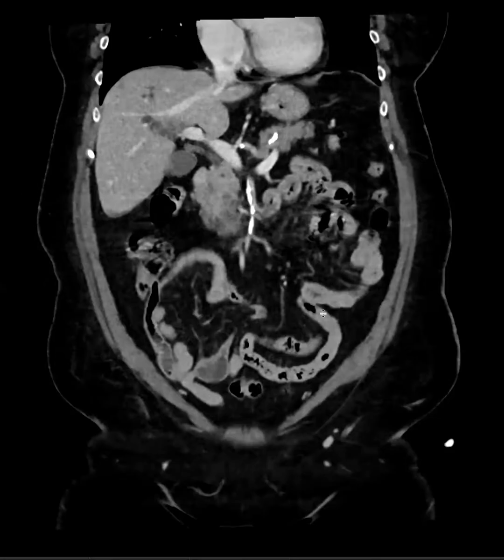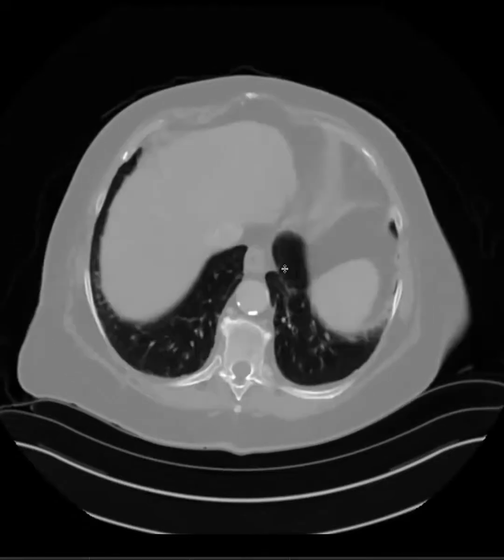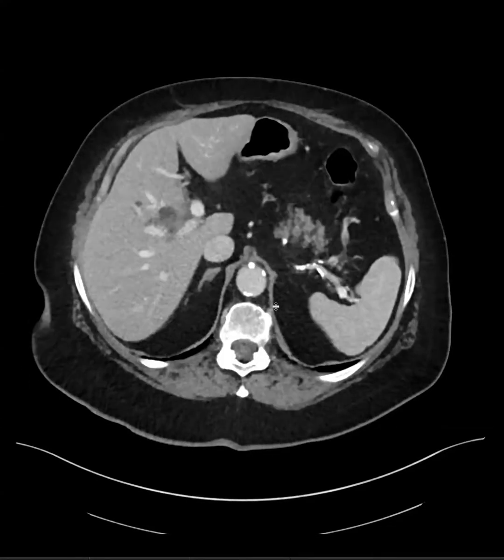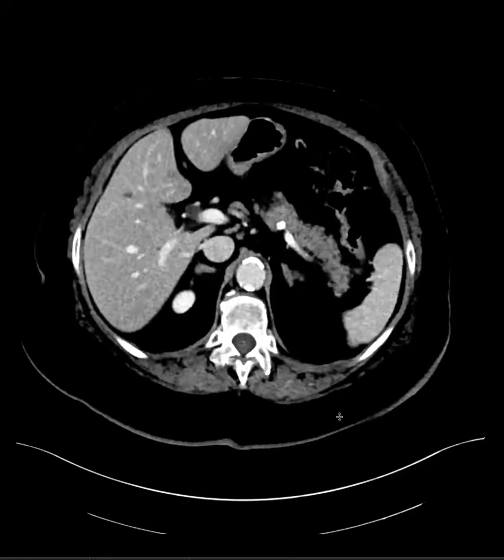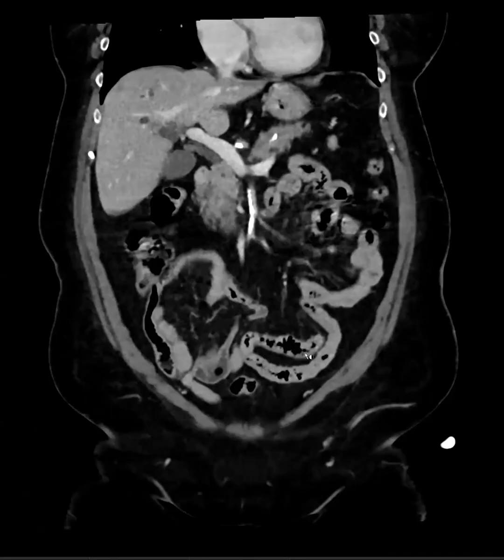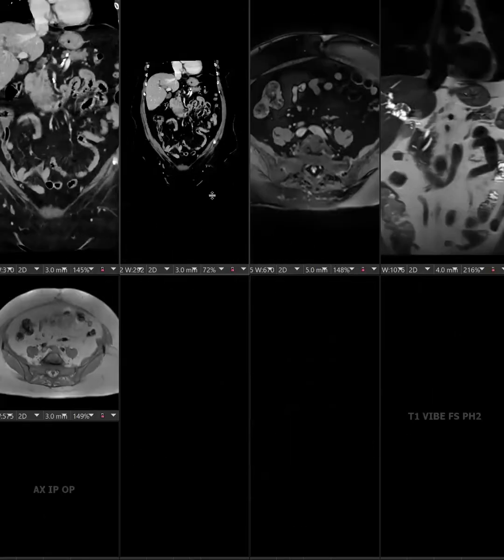Okay, perfect. Let's do this. The patient came in with right upper quadrant pain. Here the bile ducts look a little funky. I'm wanting an MRI. Sure. It doesn't look like PSC because they all seem to be connected; it's not isolated peripheral ducts. It almost looks like there's stuff inside the ducts, like sludge, and they're kind of beaded centrally. They look weird. Good. So then this is the MRI.